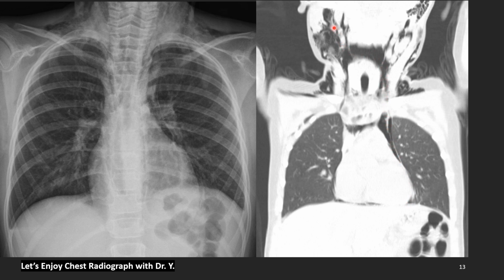Yes, gases everywhere. One thing we have to learn is that the mediastinum is not a closed structure. It is an open space to the head, to the abdomen, not a closed safe area.